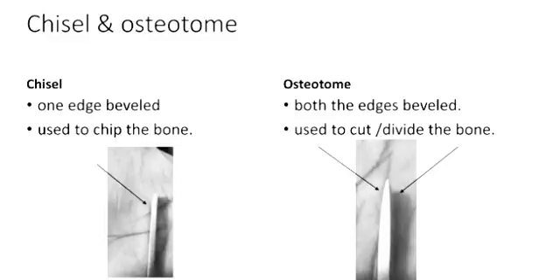An osteotome is used for osteotomy, cutting a bone. Its bone edges are beveled. It is available in different widths of the blade. Some of the commonly performed osteotomies: one is McMurray's osteotomy for fracture of the neck of femur, and second is corrective osteotomy for deformities such as genu varum, bow legs, genu valgum, knock knees, etc.